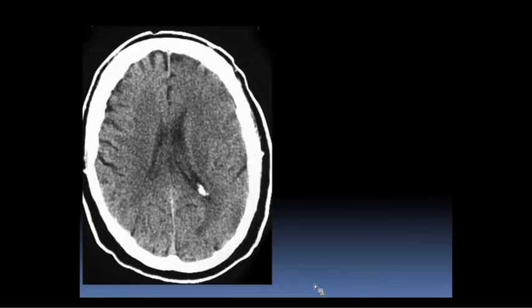So, yes, exactly. You see the bright cortex here. So you look at the periphery of the brain and see if there's an asymmetry. If you see this bright stuff here, okay, the cortex is preserved. You're not seeing that here. One, it's not as bright, and two, you're just not seeing the difference between the gray and white matter. You're also not seeing sulci as well, right? Here you see sulci pretty well. There's a degree of atrophy here. Here you're not. But what territory is this now?